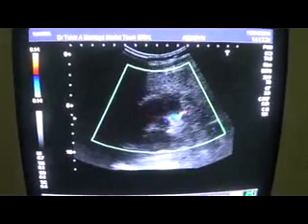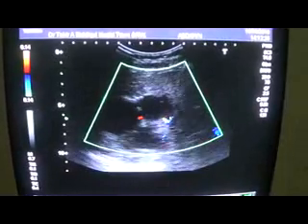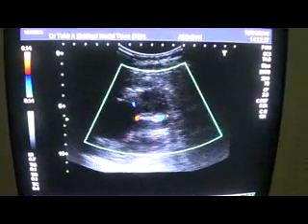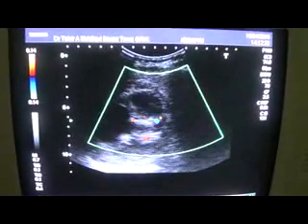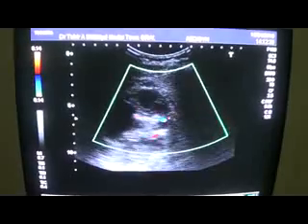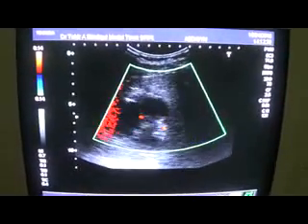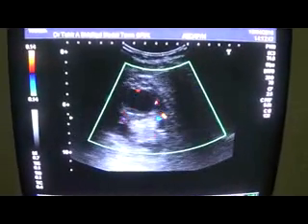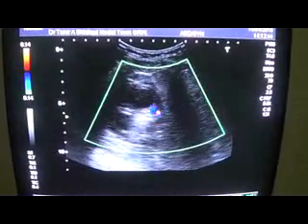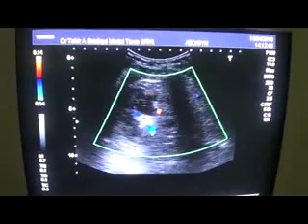So this is our case of the day relating to the obstructive uropathy on the right side because of the large calculus in the right pelvic-ureteric junction, as well as multiple calculi aggregated in the dilated lower pole calyces, with few seen in the mid calyces.